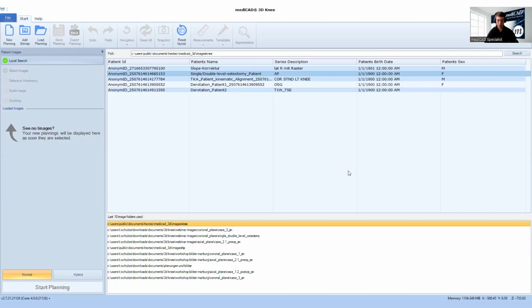We will also take a look at the torsion module, so do torsional measurements and maybe also patellofemoral measurements, primarily TTTG. That's the plan for today, so I would say we jump right into it. At the end, everyone can ask questions, also in between. I will try to check the chat from time to time.